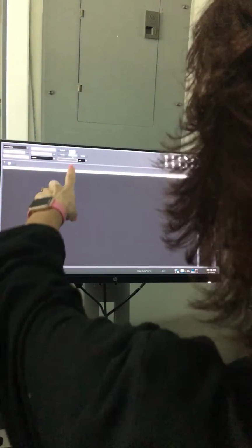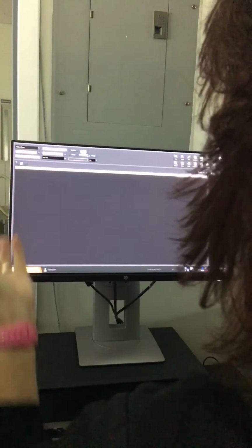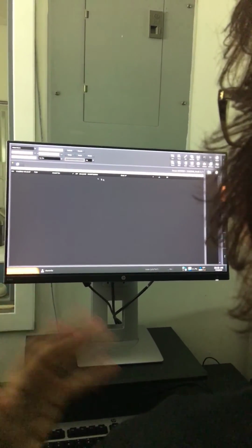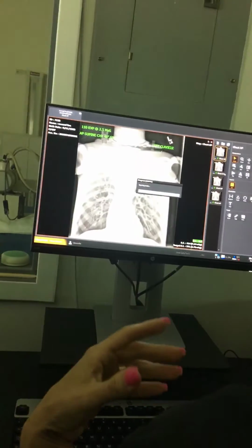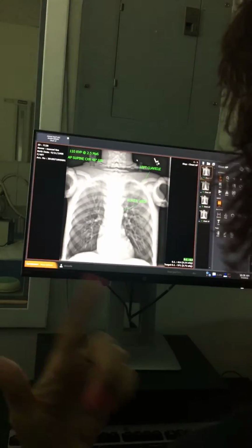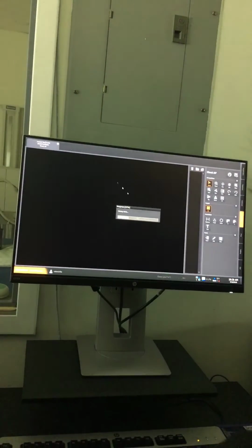Make sure you're picking, like if you shot yesterday, then it would be this week. If you shot last week, then you probably want to click month. And then it'll bring you up and you just highlight, and then it'll show you the ones that you have. Oh, it saved it. I was curious. I'll have to go see if it sent it to me or not. Does that kind of make sense? This is not hard.